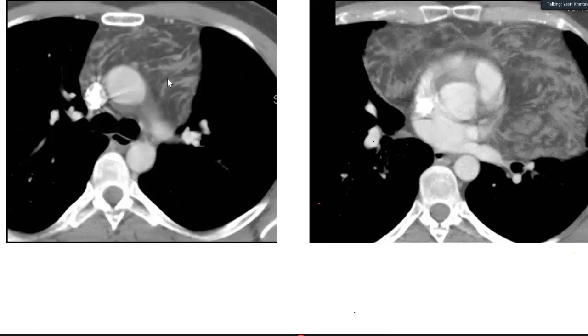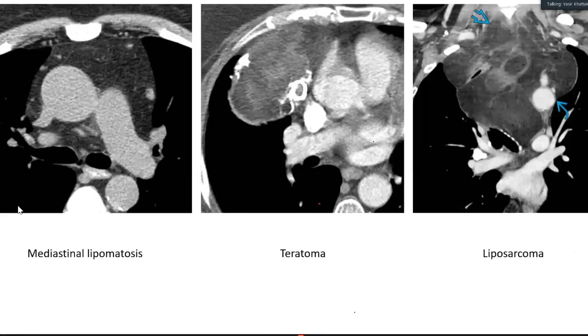If it is a lipomatosis, usually it is unencapsulated, but that is associated with obesity and also steroid use. Sorry, I mentioned that a patient with lipoma will have steroid use history. No, it's in case of lipomatosis. And if it is a case of a teratoma, then the patient will have calcifications and cystic components. Right, so there are three cases.